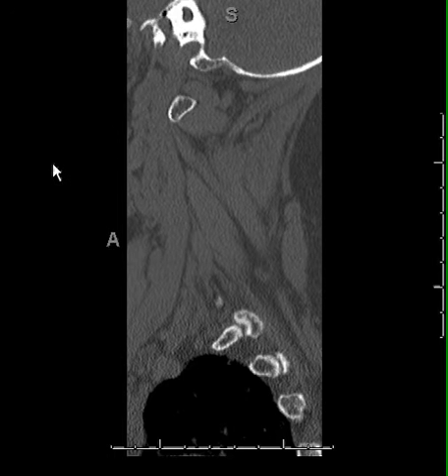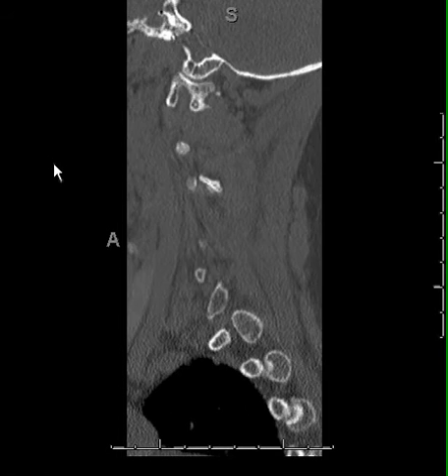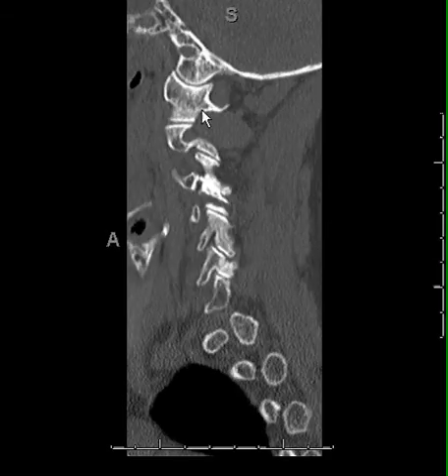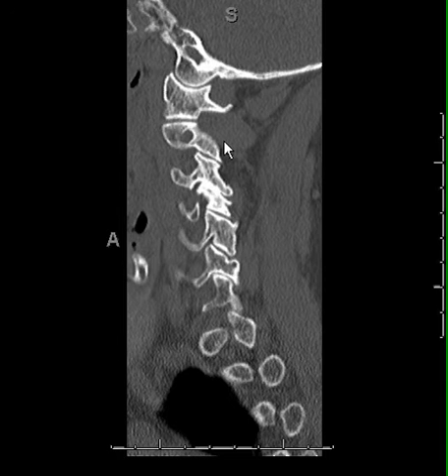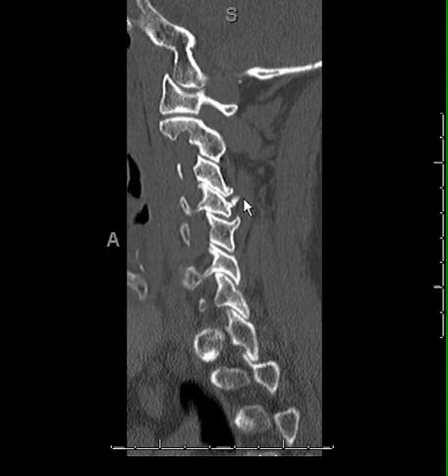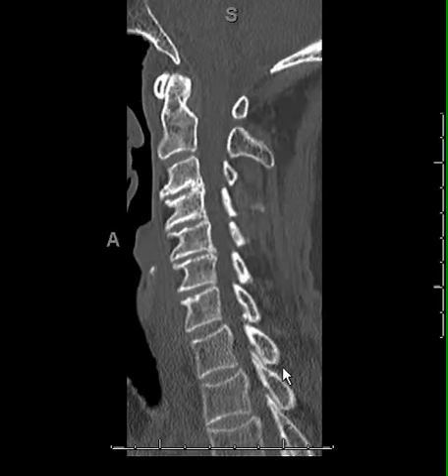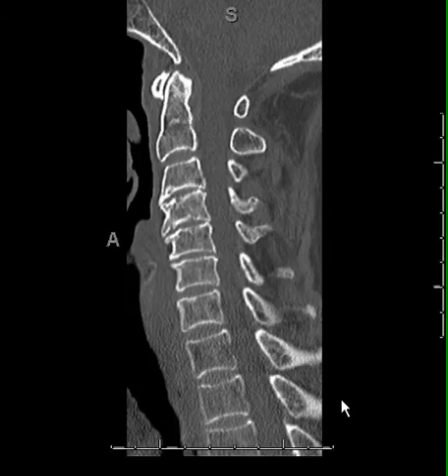So I start on the sagittal images, and as I scroll through, I start to look at C0, C1, occipital condyle C1, C1, C2, all the facet joints. I'll scroll back and forth until I've seen them all, taking note of some spurs here, nothing too terrible, but everything lines up and there are no fractures.